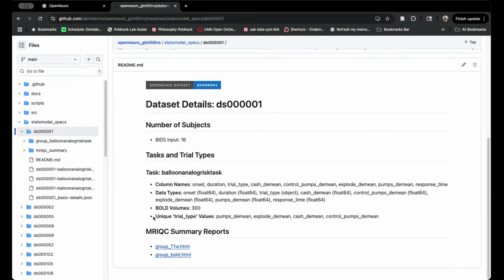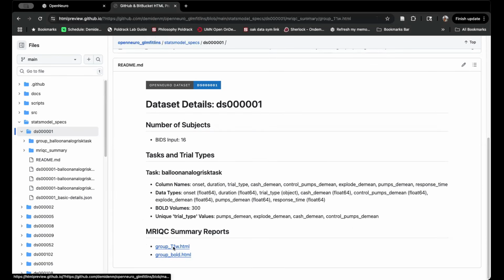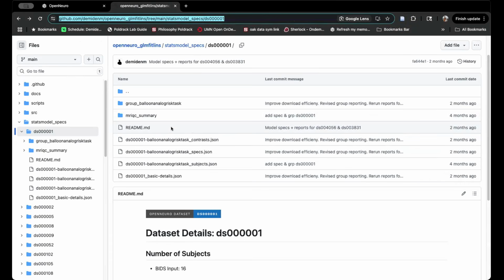Then it gives you a count proportion distribution of how many counts for each list type there are. So you easily see, hey, not everyone has 5 runs. These subjects don't. What am I going to do with that? As I mentioned, MRIQC has this link where it gives you the distributions of these values. And this is an HTML preview option, which someone created, which is neat.